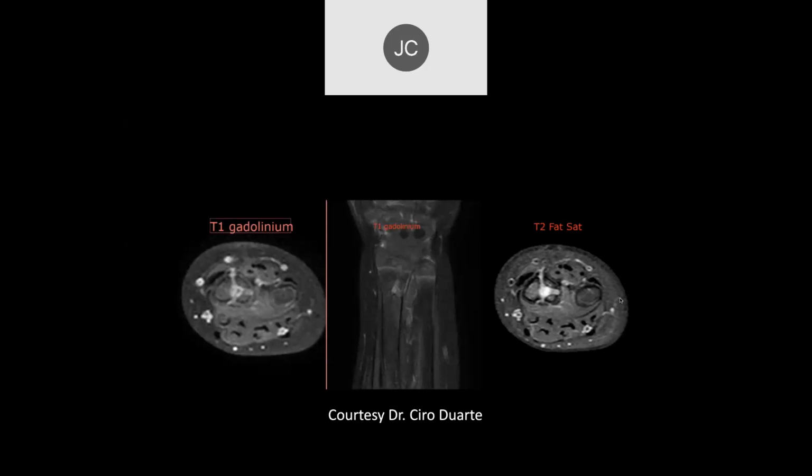It can be very thickened, irregular bone, and can cause widening of the bone in that location. If some of the central dead bone breaks off and swims around in an abscess within the bone, what's that called?